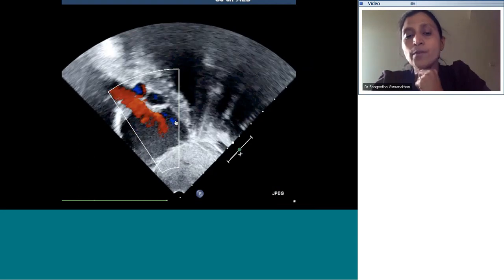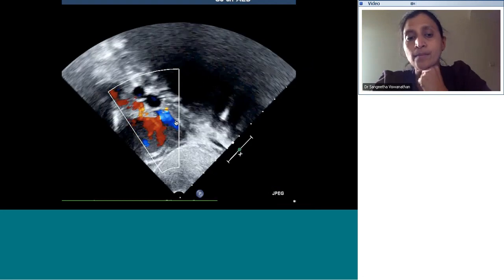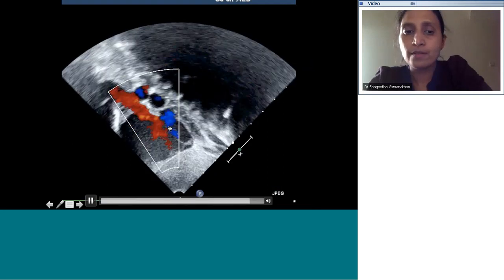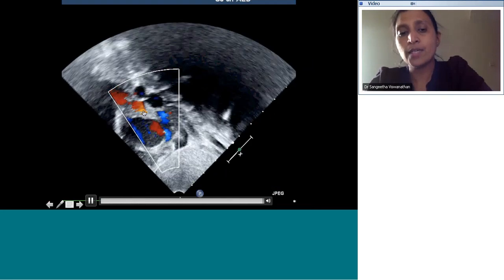What is this view that you're trying to get? Bicaval. So it's a subcostal bicaval view, right? What do you see here?